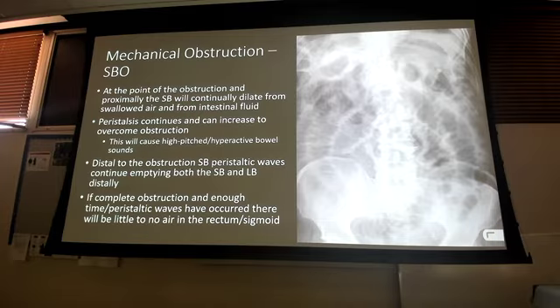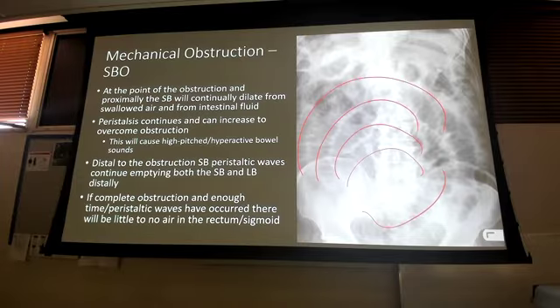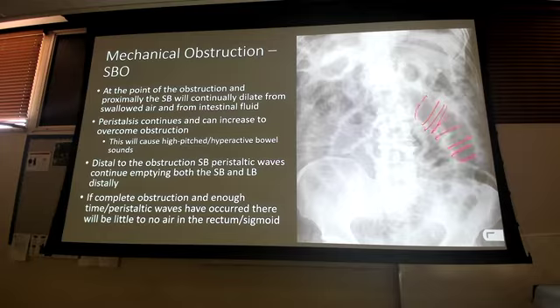And you're like, what the heck is going on here? First thing I need you to do is decide if it's small or large bowel. There's a couple of hints on this, right? It is small. I have multiple loops of bowel all sitting on top of one another. On top of that, I got my valvulae conniventes everywhere here. So I give you this and you go, boom, I know it's small bowel.